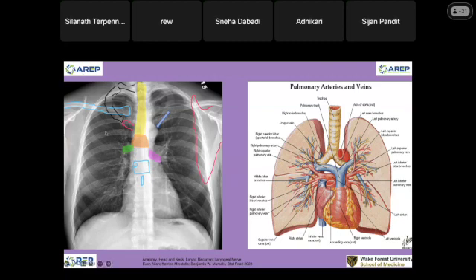So what structure do we look for, something else compared to this illustration? This person is a young person. The bone doesn't look so bad. And she has very dense breast soft tissue. The left breast looks a bit denser. Maybe aortic arch or node. Okay. Is that correct? So this one is our aorta, right? We probably leave it alone. The aortic knob. Okay, next structure. Because we don't normally do mammogram when we start doing breast cancer screening at 40 years old. She's for sure younger than 40 years old.